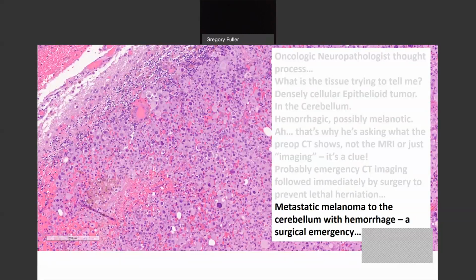What you're looking at right now, with the magnification also, with those limitations, that will be all you'll get in a tiny fragmented, hemorrhagic stereotactic biopsy sometimes. And you're going to have to recognize cerebellar tissue, meninges, peripheral nerve. All of these clues can help you tremendously. Lipofuscin in a large projection class neuron tells you you're in the brain because that is a neuron and it's surrounded by tumor. That's important.